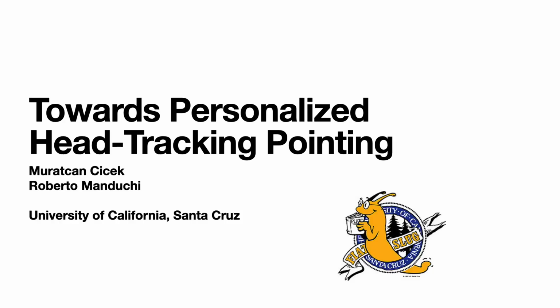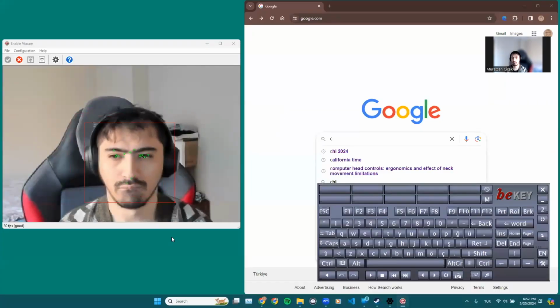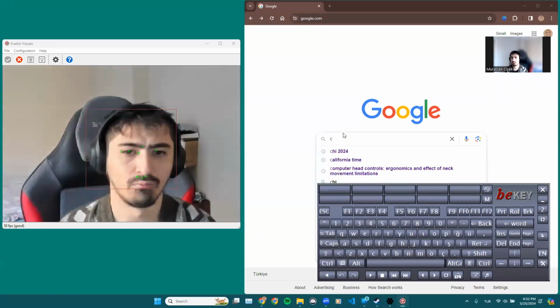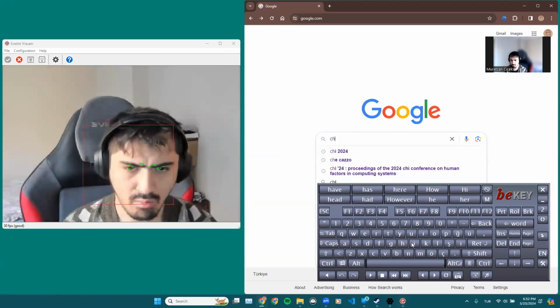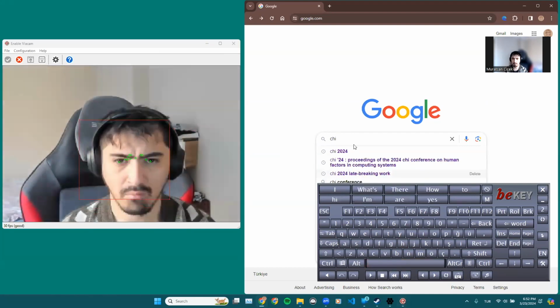This is the video presentation of the paper Towards Personalized Head Tracking Pointing by Cicek and Manduchi from the University of California, Santa Cruz. Head tracking pointing allows users with limited upper limb mobility to move the pointer on the screen using their head, whose movement is measured by a user-facing camera. This video shows the first author, Cicek, using the Enable ViaCam head tracking system with a virtual keyboard.